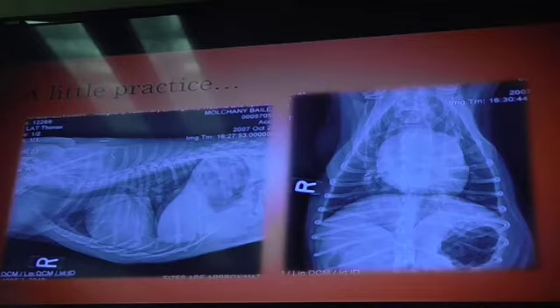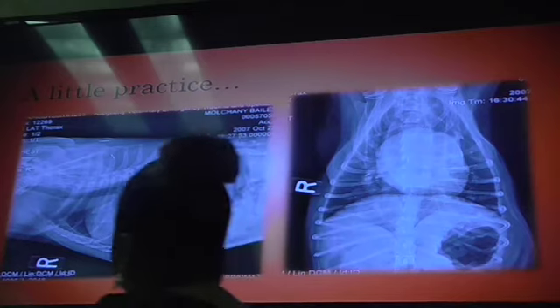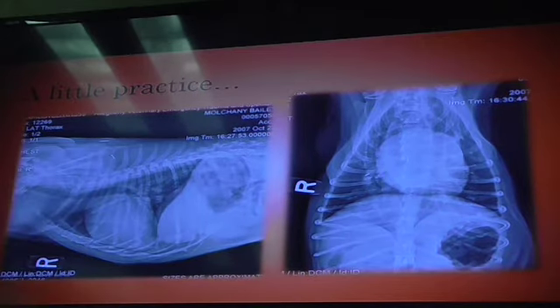Yes, sir. So, how do you determine this artery versus the vein, the lateral one? I was assuming it was the vein, but I cannot see that. Did you get up and look and see where your artery, bronchus, vein trio are? Okay, everybody go to the TV at least once, please. I can't sit here and just point things out to you. I need you guys to try to look on your own and go up close. Radiology, remember I told you guys it's like that art thing where you look at it close, look at it from a distance, look at it close, look at it from a distance.